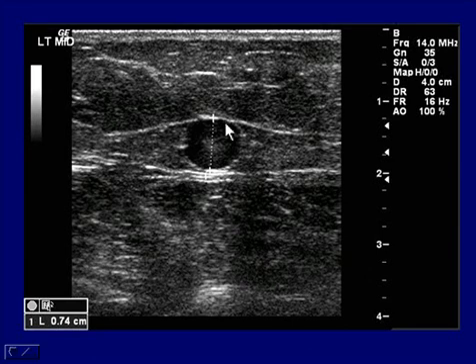This slide illustrates the normal anatomy of the great saphenous vein. It's usually encompassed in a fascial boundary. We can see this bright white line here, which is fascia, and this white line underneath it, so it's sort of wrapped here. If you look at this, it kind of looks like a little eyeball looking at us. Here's the eye staring at us, and here's the eyelids. That is the normal planar arrangement of the great saphenous vein.